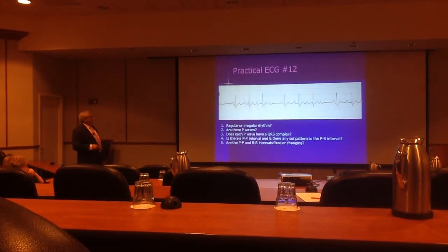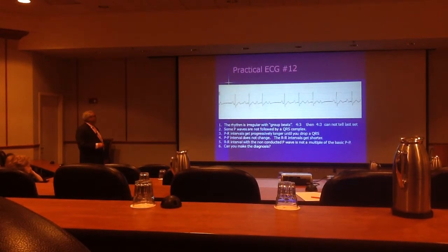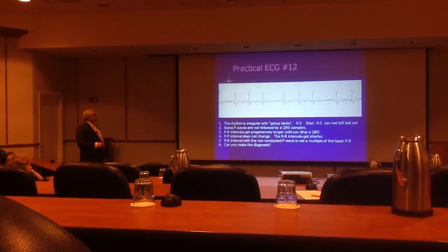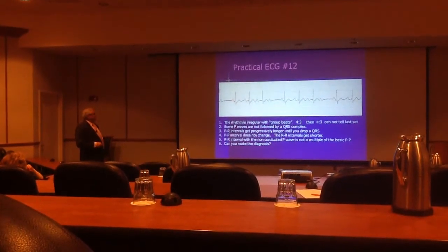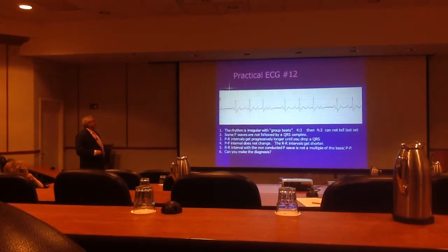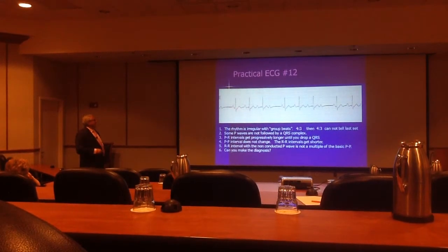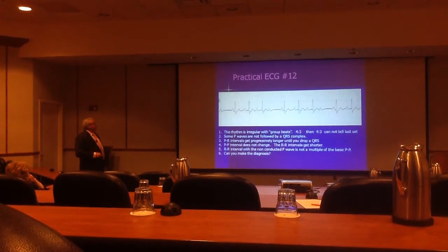Okay, what do we have here? Groups, yeah. So we have groups of beats, so look for the P wave. P, P, P, P, nothing. Okay, PR intervals. One increases even more, and then a P with nothing.